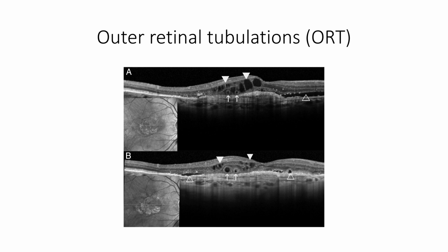This is a case of age-related macular degeneration, as we can make out that there is a distortion in the retinal pigment epithelium, and there's an amorphous collection of subretinal tissue, and there's a clear SRF with some deposits here and cystic changes in this retinal area.